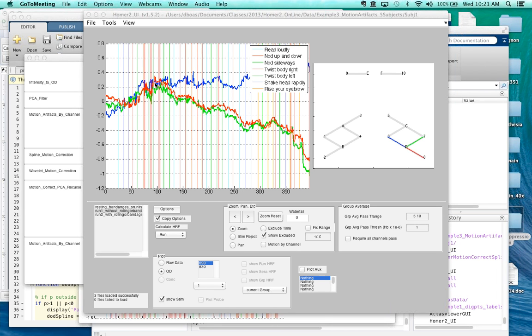People have asked us in the past whether or not it could just reject it for the channels on which there was the motion artifact, but that creates kind of a bookkeeping challenge. And it's a bookkeeping challenge we can handle, but then when it comes to writing your paper, you have an even greater challenge of describing how for different channels you had different numbers of trials.